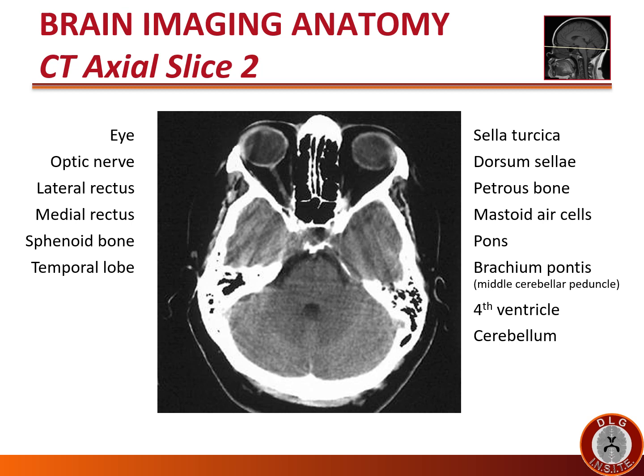This is a slice more rostral, as you can see in the upper right corner. Again, on the sagittal image, mid-sagittal image, you see the slice level where the slice comes from. Pause for a moment and take some time to see if you can identify the structures that are listed on this slide.